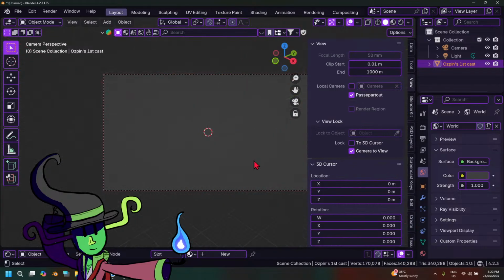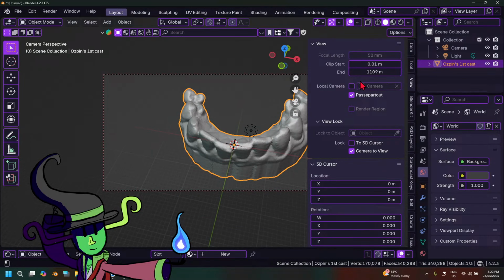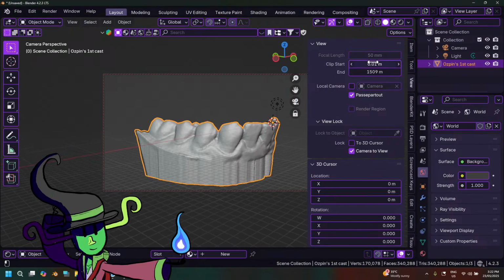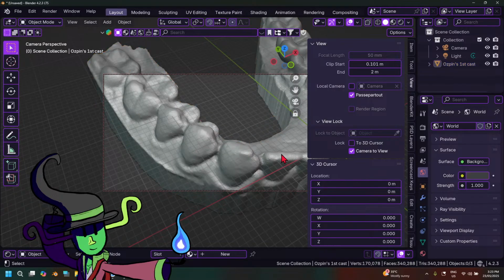Well, here's something you can do, guys. You can open up Blender. I'm gonna increase the end start here to a higher number. Let's say 1 maybe. Nope, that's not it. 1.5. No. I want to get a better view of this, Blender. Please function for me. Okay, so for some reason Blender is not functioning right now.